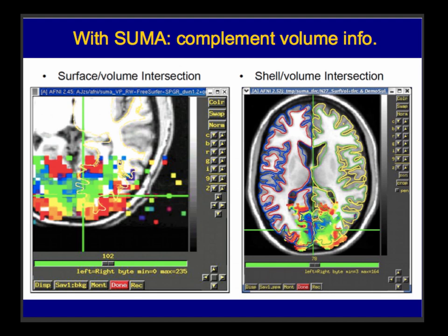What we really care about, especially with gray matter, is that it's not just a flat layer somewhere, but it wraps around as a cortical sheet that goes all around the white matter. So what we really care about is looking at lots of these things simultaneously and following these around. And then this stretches out of this plane. That's why we'd really want a different way of viewing the data.